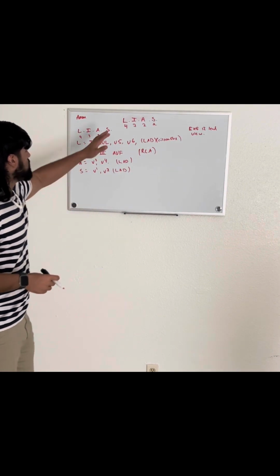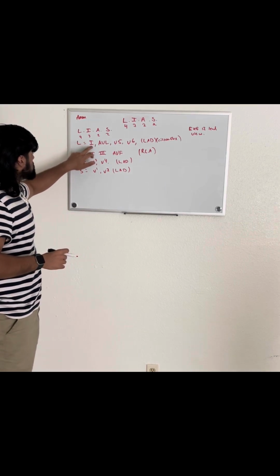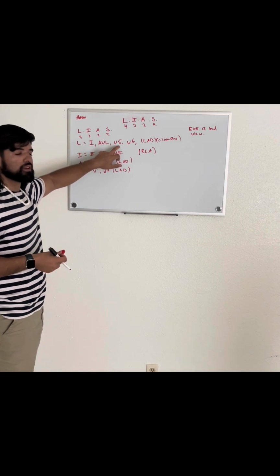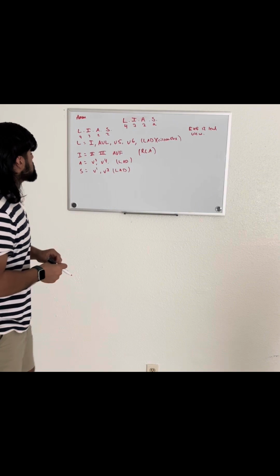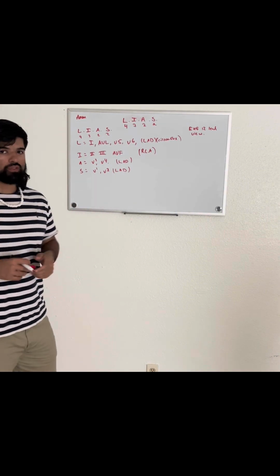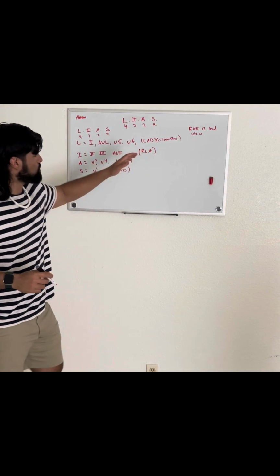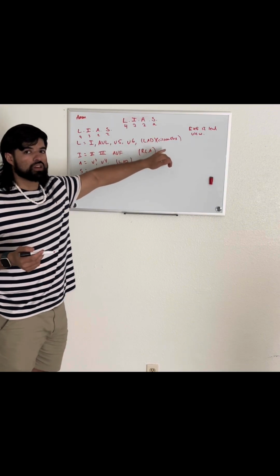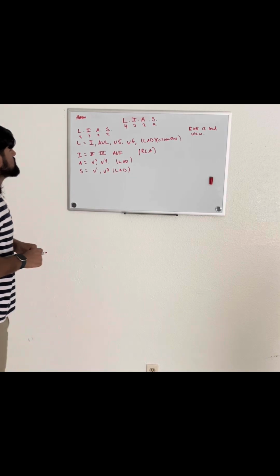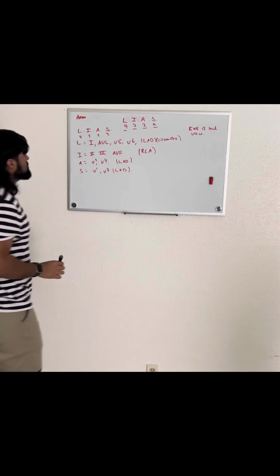For example, L as in the lateral view, which is going to be lead 1, aVL, which is left arm, V5, and V6, right? So that's what we're looking at when we're looking at the lateral view of a 12 lead EKG. And we're also going to be looking at the left anterior descending coronary artery and the circumflex coronary artery. So always remember 4, 3, 2, 2, right?